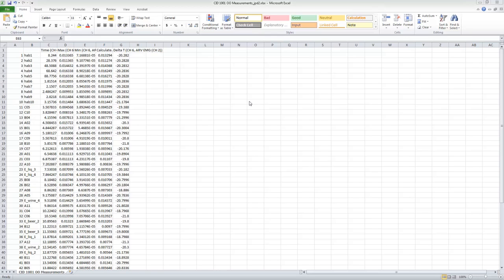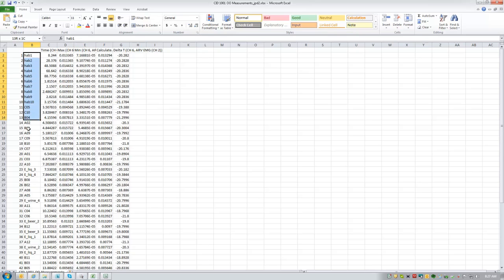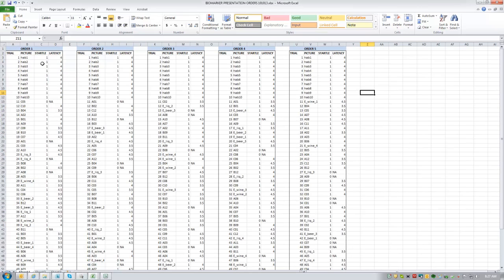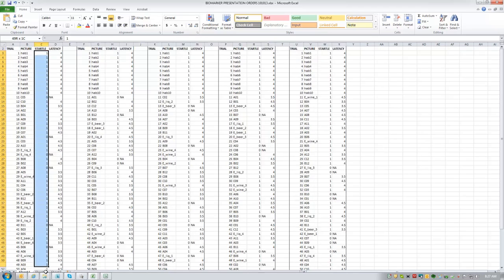Okay, this video is going to show you how to process the data after it's been extracted. So that would be the previous video. At this point we have all of our startle values and we've laid down the tracks for our categories within each trial. One of the things I didn't mention in the last video is it might be good to see where there's a startle per trial and where there is not.